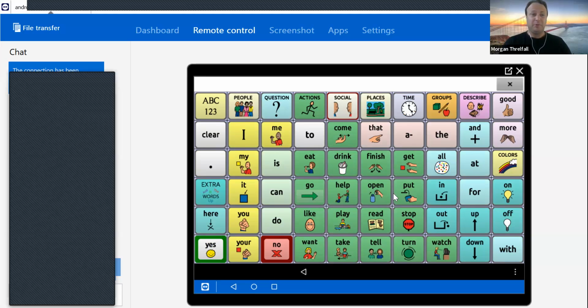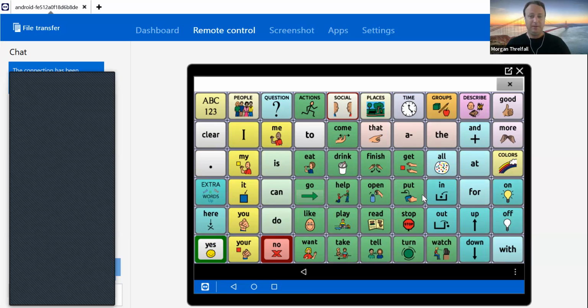Again, I wouldn't go overboard with creating too many icons or too many folders. These core words on the front are the words that are used most frequently in the English language. Words like classmates, words like pizza, we don't actually use very often throughout the week. So add it in there if it's really important to your student, but don't spend too much time personalizing the vocabulary.